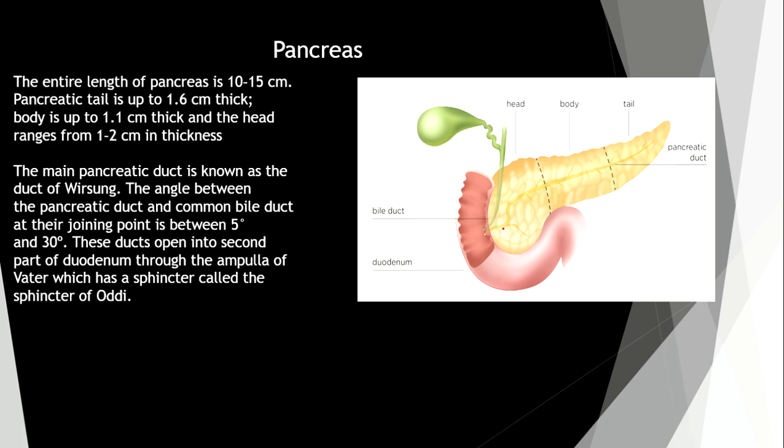On a normal CT scan, you don't see the pancreatic duct. If you see the pancreatic duct, it must be dilated for some reason. Maybe a tumor is placed here, or maybe there is calcification along the pancreatic duct. I don't know, but some reason disturbed this pancreatic duct, and you can see it.